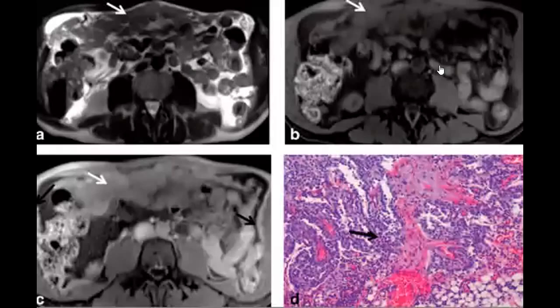It's multiple lesions. So multiple lesions, you are talking about, for example, metastasis or lymphoma, or in this case with omental, like have multiple peritoneal lesions. So you are talking, could be carcinomatosis, peritoneal carcinomatosis. So it can be a primary as mesothelioma or secondary metastasis from ovarian cancer, for example. So you are talking to try to limit the differential diagnosis, but finally you will say that it's differential diagnosis. For example, this case was mesothelioma.